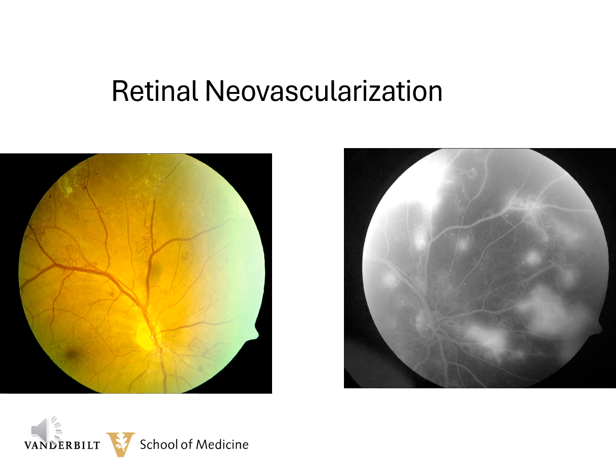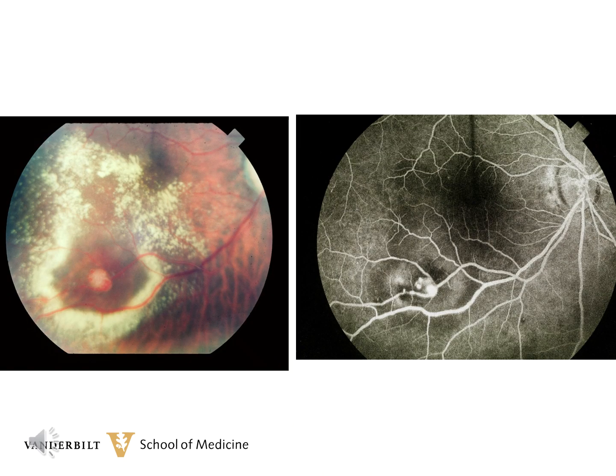The fluorescein angiogram is very classic. There's capillary non-perfusion, and you can see this because the major area of the photograph on the angiogram is dark. Because the neovascularization does not have tight junctions, there is hyperfluorescence because the fluorescein is leaking out of the neovascularization into the vitreous cavity.